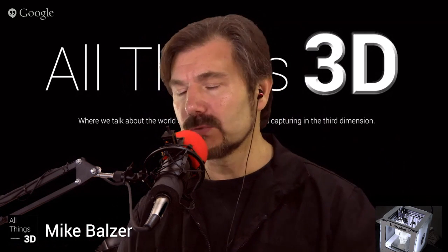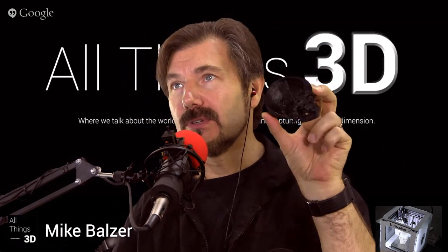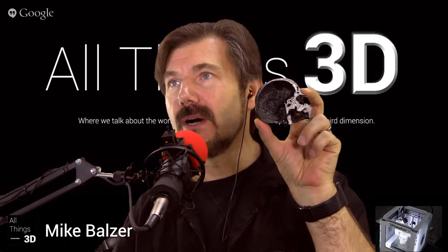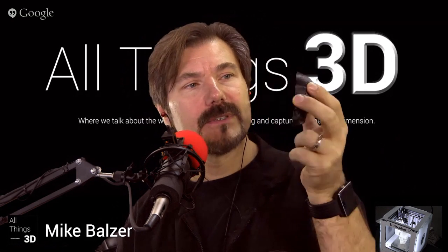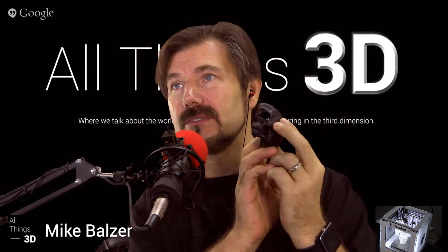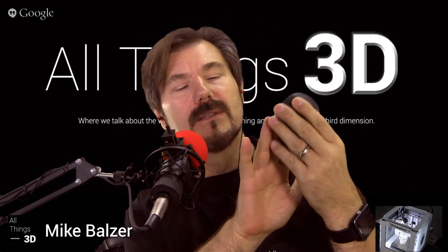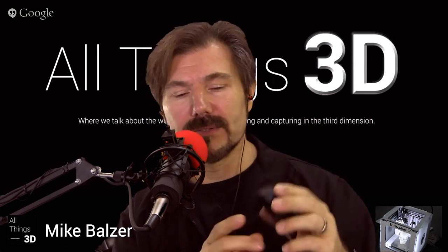The other cool thing, those were both one-times scale, or full scale. Here's a little mini version. I think this is maybe a 1/3 model. And if you notice, this is cut differently. That showed the anterior view. This is the sagittal view. So again, same model, same hole, but now we can look sideways. So we're going to explore how we can actually do that and create models from it.